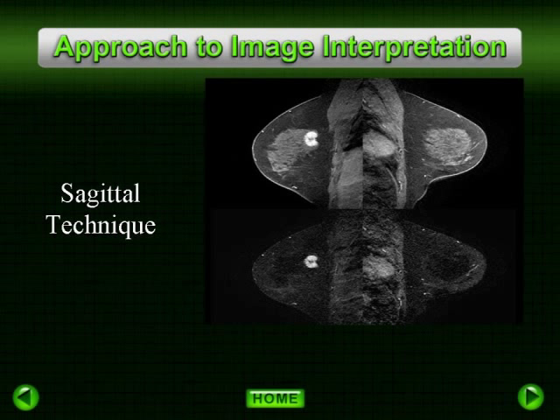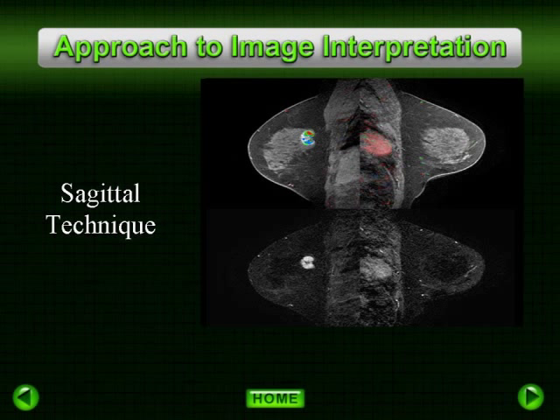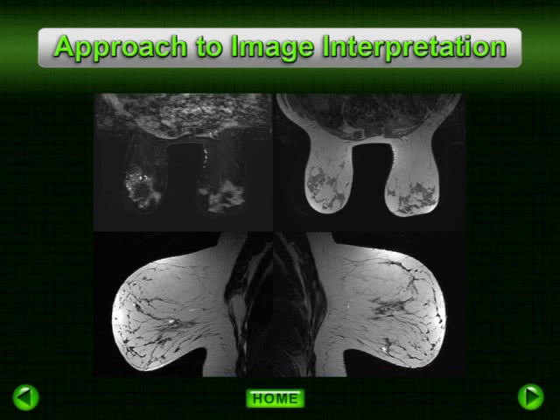In this hanging protocol, we place the right and left 1-minute fat saturation acquisitions back to back. Below this, we place their corresponding 1-minute subtraction acquisitions. As you are evaluating in detail, slice by slice through the parenchyma, color parametric mapping can be applied to evaluate the slice by slice enhancement kinetics. As we are evaluating the information on each individual slice from our first post-contrast image acquisition, we design a final hanging protocol to simultaneously display our additional orthogonal unenhanced pulse sequences to allow for slice-by-slice cross-referencing to evaluate the signal characteristics of any suspicious foci of enhancement.